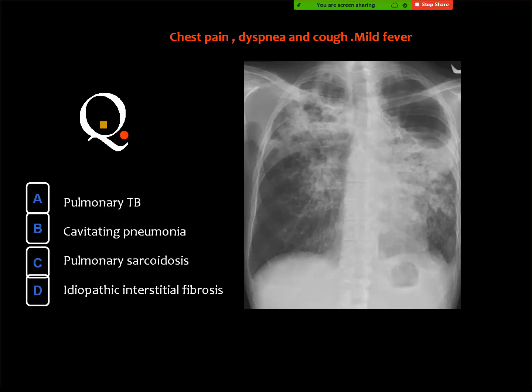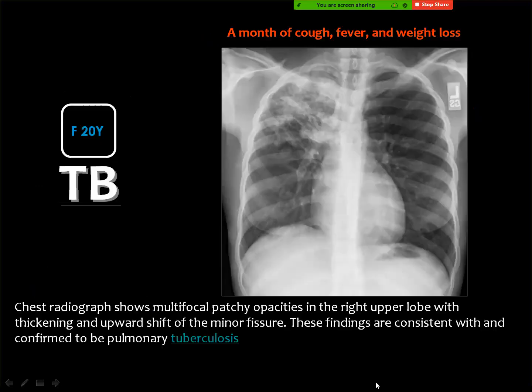Doctor, excuse me, chest X-ray, there is a cavity in the right apical zone? Yes, there are bilateral cavities. This is a big one, and this is a smaller one, and another one here. Okay. Thank you.